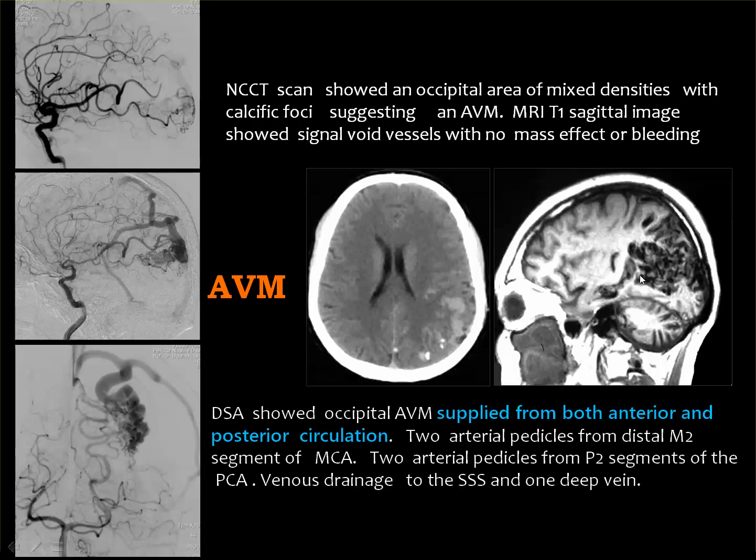And you can see the vascular malformation on MR. But if you want to see the feeding vessels and the draining veins, it is the job of angiography. And we are no longer trying to do this in the reports unless they are clearly evident. If you see the feeding artery is very big and the draining vein is also very big, then you may say that this artery is the feeding one and this vein is the draining one.